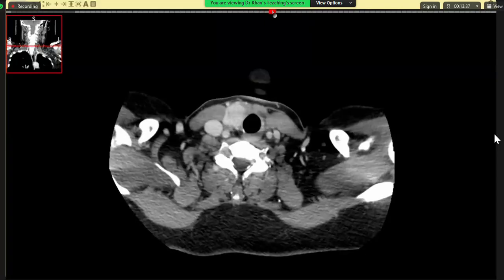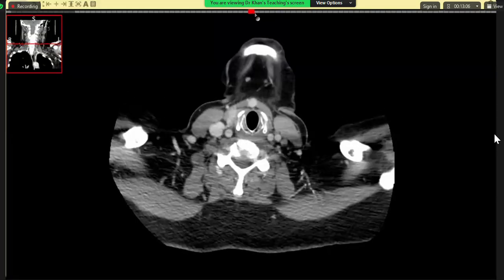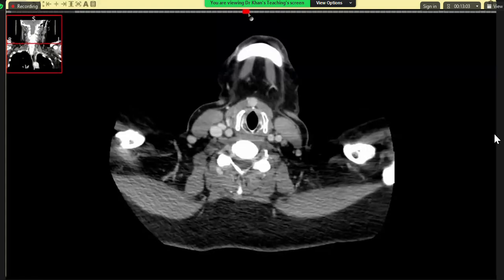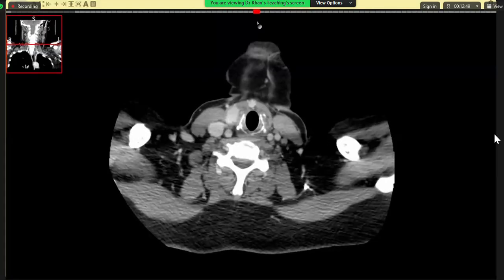What do you mean thyroid isthmus? No, the isthmus of the thyroid. What is that? The part between the two lobes of the thyroid, the isthmus. Oh, so you're talking about that. So is there a connection with the thyroid, this nodule? Let me check it again. No, sir. Actually, it's not connected to the thyroid. Yes, it is in front of the trachea. Yes, this is the trachea.